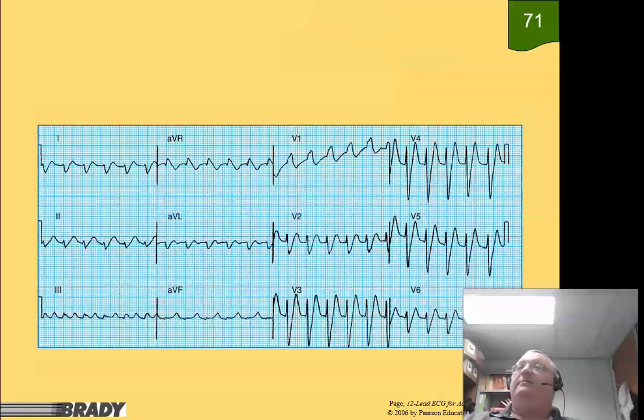Let's see here. Let's go back. Down. I'm not really sure. V6 is down, though. That one's up. Good enough for me, okay? Oh, yeah, by the way, the little mountain, big mountain, I would say we definitely have a steeple right there, okay? So, again, it should be a big mountain.